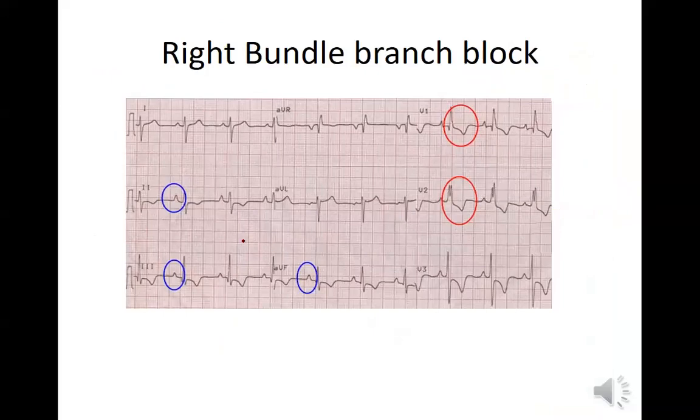So let's read an EKG. I know it's got some circles on there, but what the heck? So let's look at AVR. That one's a tough one to see, but it could be positive. If I count boxes, it looks like maybe it's a little more negative. Not very good for us, but something is wrong.